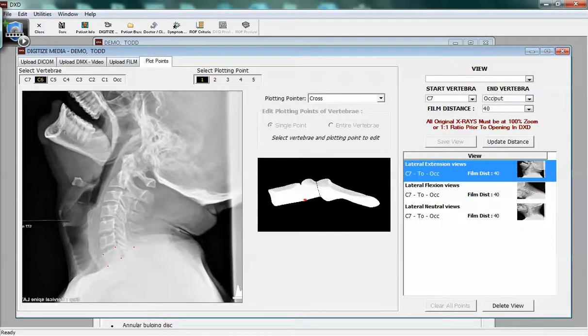Now you're going to C6. Always the same order. Spinal lamina line. Now we're on C5. Same order. We're always going from the posterior inferior corner to the anterior inferior corner to the anterior superior corner to the posterior superior corner to the middle of the spinal lamina line. Now we're on C4. You can see that this is tracking us at C4 right above here.